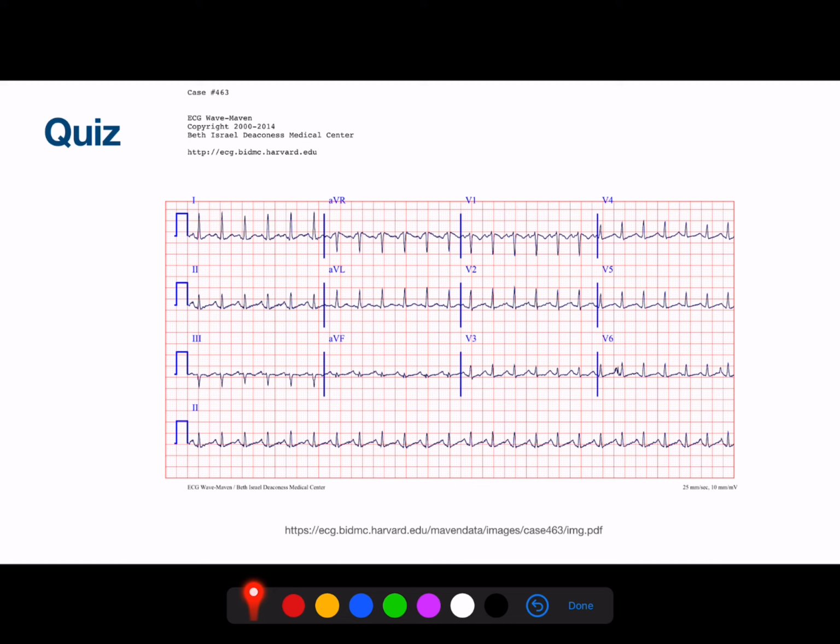If you don't see a P wave in every lead, it's not a problem, because again, it depends on how you put the ECG on the chest. Sometimes you see it, sometimes you don't, but the important thing is that in some of these leads you have to see the P wave. If you don't see the P wave in any lead, then you have to go from there. But in this case, we see a P wave in some of these leads. The PQ time here is below 200 milliseconds, so we know it's normal conduction. And the QRS complexes are small, so there's also no problem.